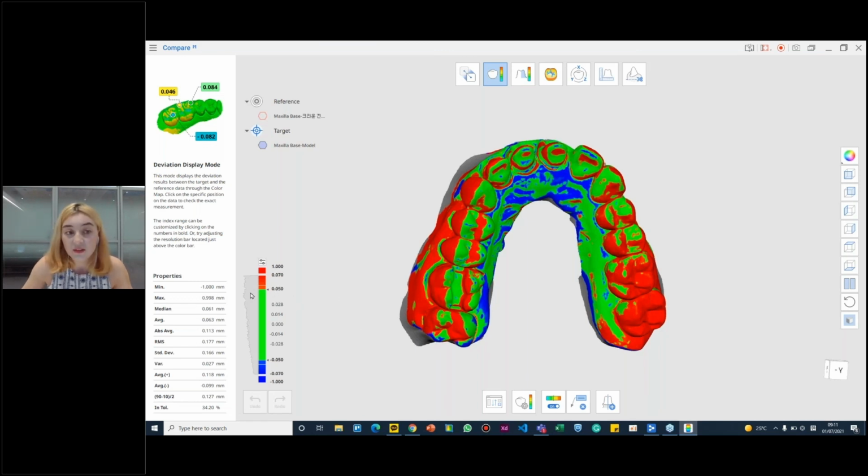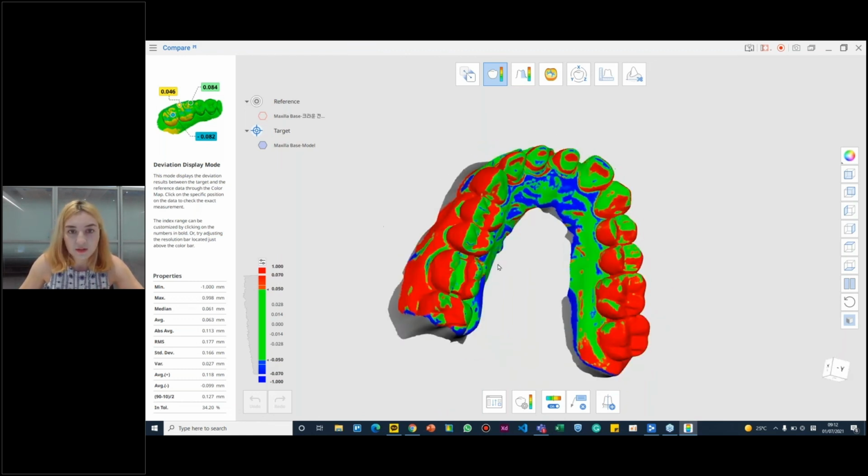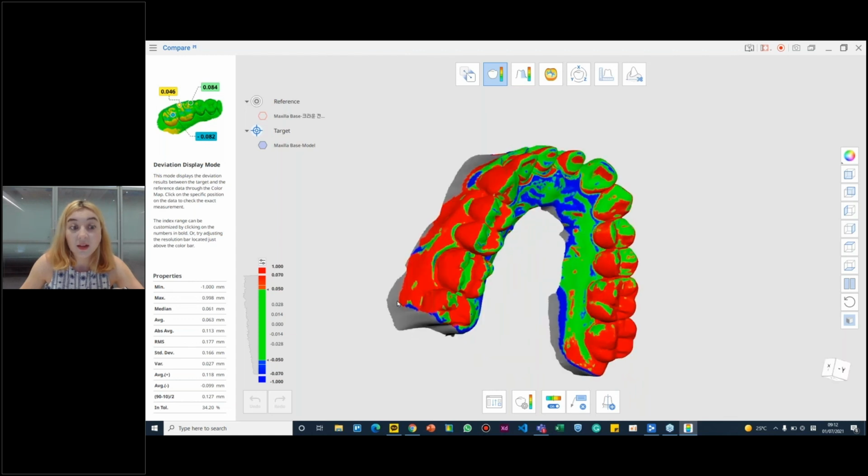Okay, that's good. So here they promised me 50 microns, so I set 50 here as an acceptance criteria. So everything that is acceptable will be marked in green, and everything that is not acceptable would be either in red or in blue. So can you show us how to change that 50? Okay, you just click on that. And you can change your criteria there. So if 40 microns was your criteria, then you could change it accordingly. Yeah. So this is going to look like with 40.